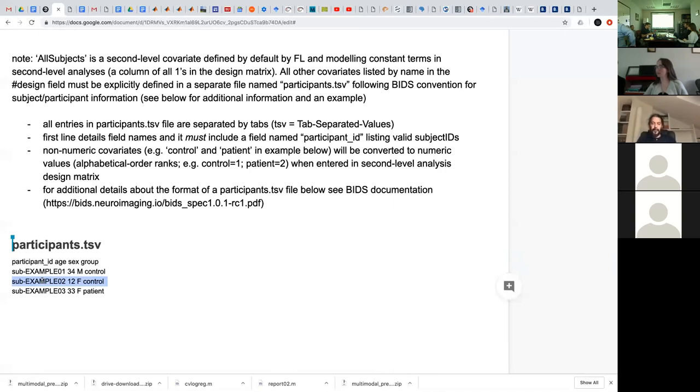Yes, there are different ways to drop a subject. If you want to drop a subject as in let's make it as if this subject never existed, actually delete the data for this subject and delete it from all of our second level analysis, then yes, you could do that and delete all of the folders for that subject and delete it from this participant TSV file. But I don't see many cases where that might be a good idea.